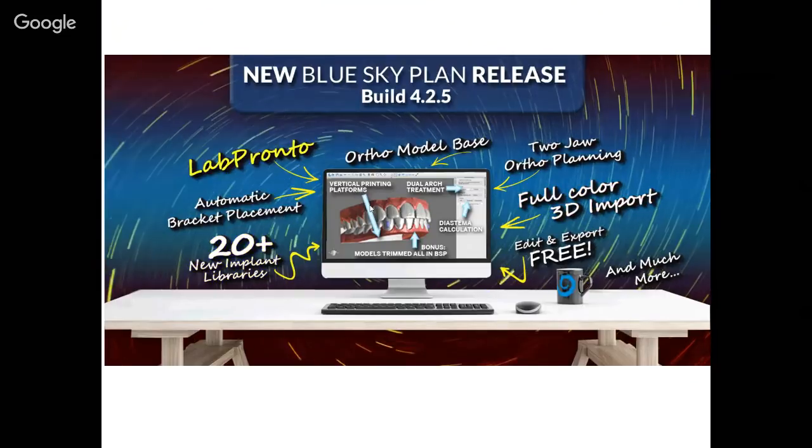We also have the lab Pronto functionality, which we are going to be discussing, as well as the full color STL OBJ import, as well as new functionality in Blue Sky Plan that you could actually edit different surfaces, models, and CT scans and export them at no charge. So we'll be discussing that as well.